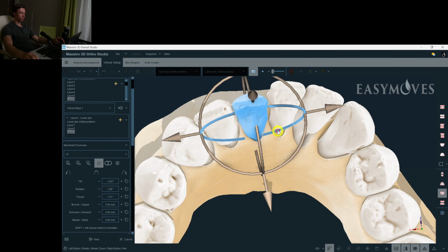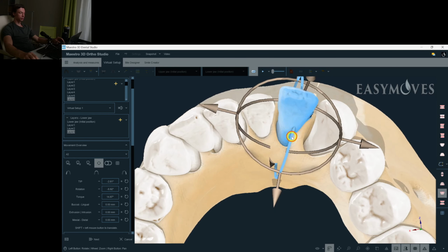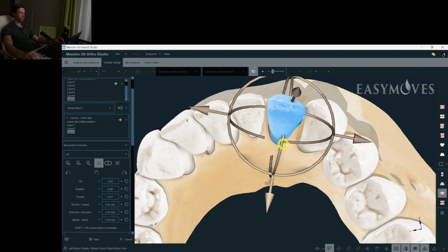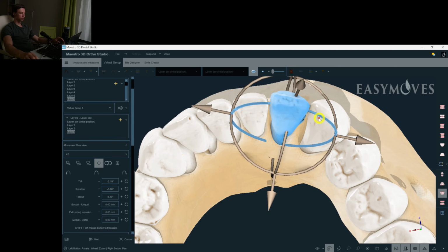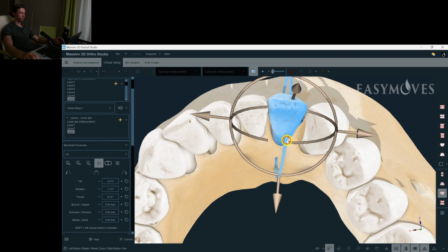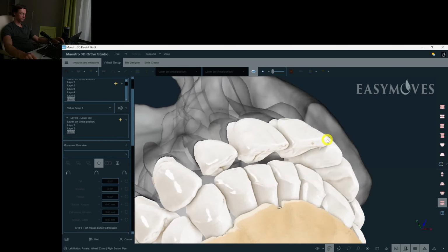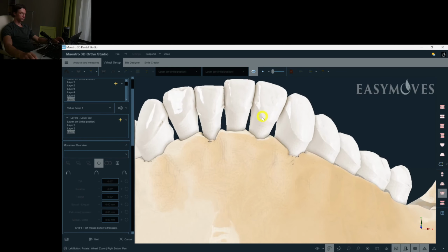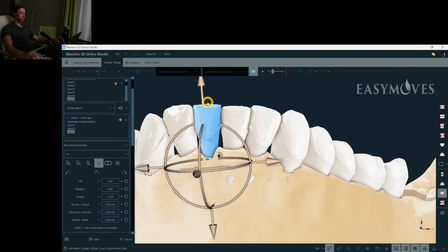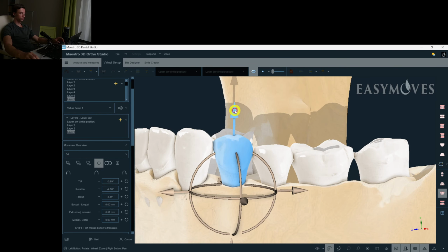We achieve it by lingual tipping of the frontal teeth and extrusion of the lower premolars. So we combine the intrusion of the incisors and extrusion of the premolars.